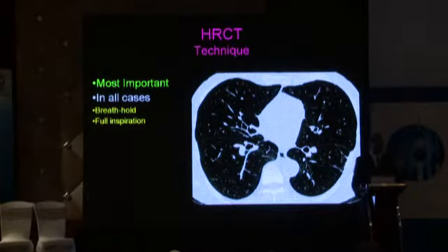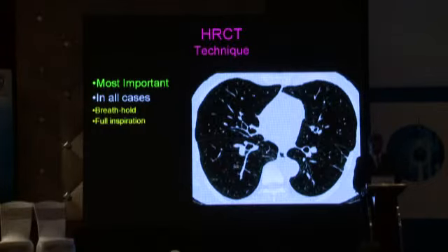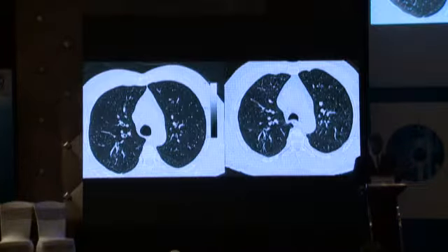Same patient, virtually at the same time, same level. This is the inspiratory image. This is the kind of image that we require that would then allow us to say whether this is normal or abnormal. And I'll run through this again. That's the expiratory image, and the way to make that out is to see that there is increasing whiteness as we go from non-dependent to dependent, as against this being the inspiratory image that we require. So we need images in full inspiration, and we need them with suspended respiration.